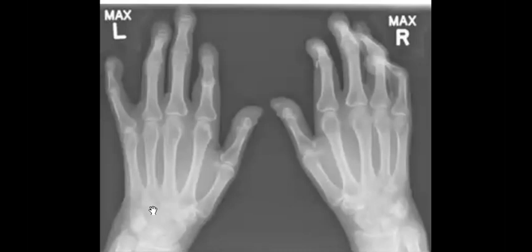you will try to find, as you mentioned, Fauzi, the erosive arthropathy, sclerodactyly, and the contractures. Trauma, diabetes, Huda, trauma, Ala, frostbite, psoriasis, Marwa, perfect. Nirmeen, welcome. Scleroderma, soft tissue calcification, doc. Okay, so scleroderma, let's summarize.